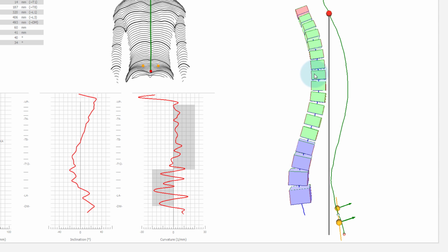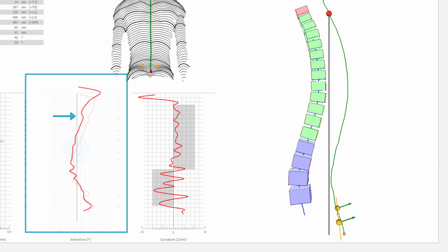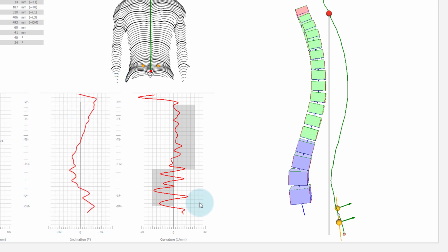Maintaining this alignment is, however, one of the highest maxims of the physical autoregulation and is found intact with the vast majority of the human population. Following this principle, it means that the graph should consist of a primarily diagonal course in the optimal case. Conspicuous parallel positions are characterized by a vertical curve. Try to match local complaints and local clinical findings with the curve. How often does your clinical impression coincide with this view?